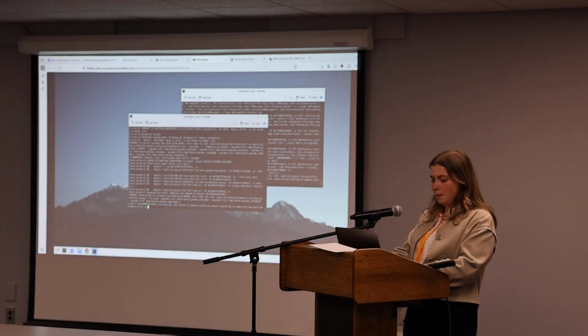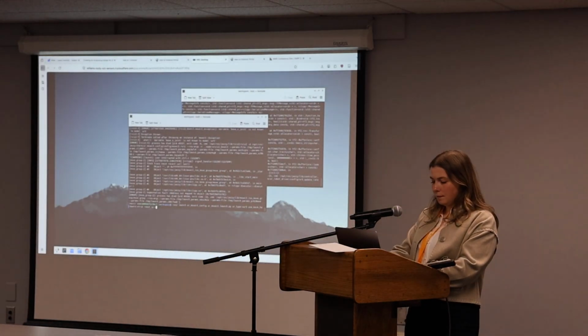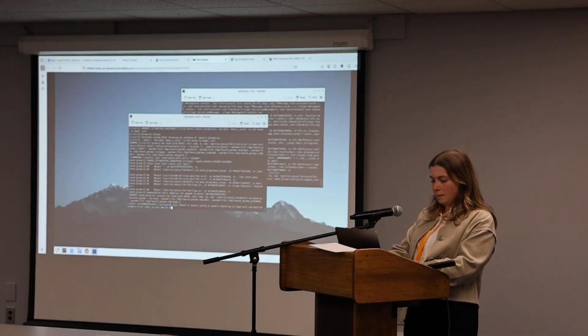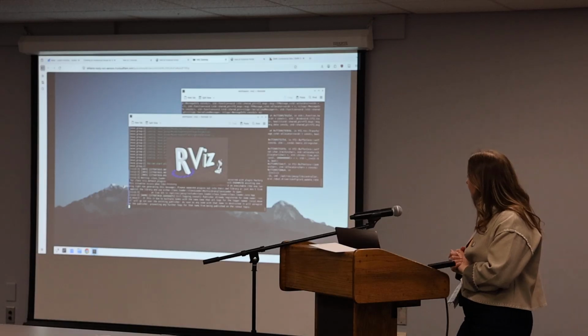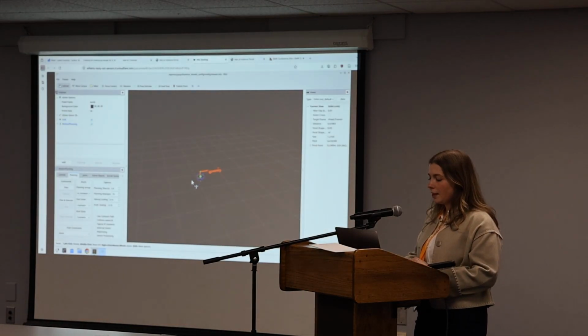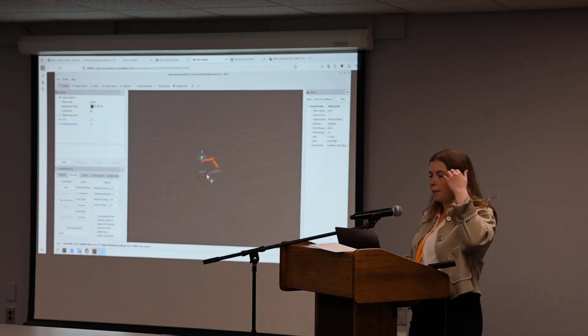I need to do the robotic view. Okay, so you should see the UR pop up. You can move it around with this little thing. That's your goal state, that's your UR. Is that working for people?